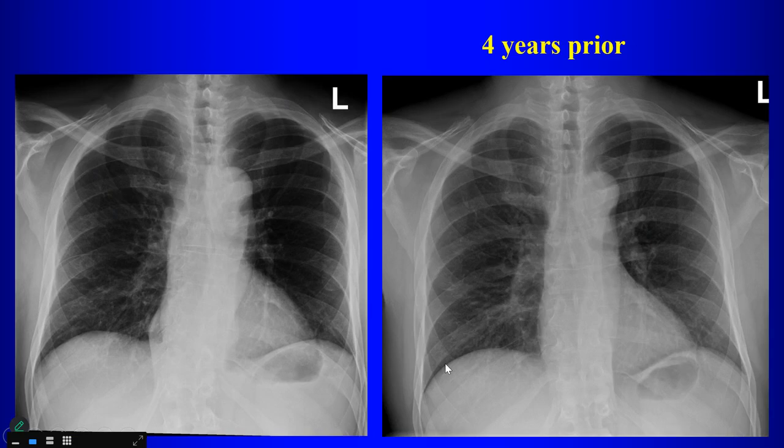I will show you the current study, the study 4 years prior, what looks different. What's different on the x-ray? I don't see anything. Well, you have to be able to tell us what's the finding on the x-ray. It should be like the vertebral body should be destructed. Do you see that? What do you see on the x-ray? Tell me what you see on the x-ray.